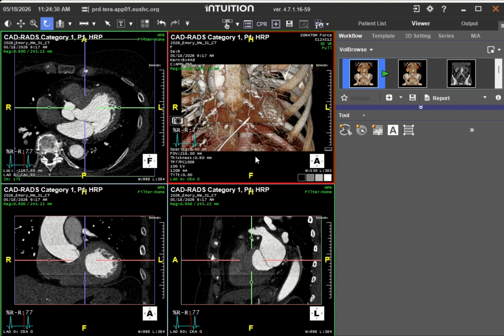And we sample the line from the bottom of the screen to the top of the screen for something called a stretched CPR. So the one everyone's most familiar with is stretched CPR. And for the rest of the video, if I say CPR, that's what I'm referring to.